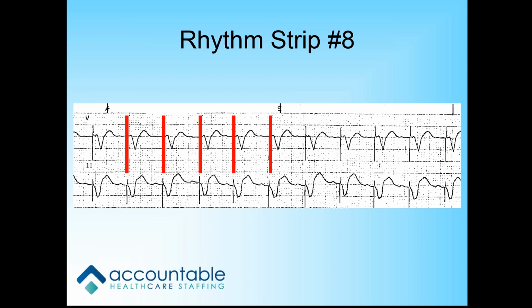All that an inverted QRS tells you is the lead you're in. So the deflection doesn't really mean anything, because you can change that deflection depending on the view of the heart you're looking at, which is determined by the leads of your EKG. So those straight up and down spikes, anytime you see those, you are in a paced rhythm. Okay, good job. Thank you.